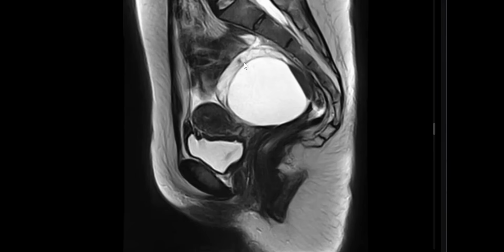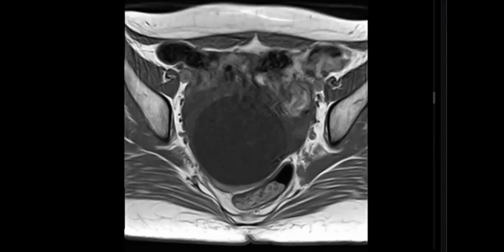Edema in the presence of a mass or cyst in the ovary is a good, reliable sign of ovarian torsion. So could this edematous stroma be endometriotic or a hemorrhagic cyst within the ovary? No. It's a fluid. Okay, this is a functional cyst.